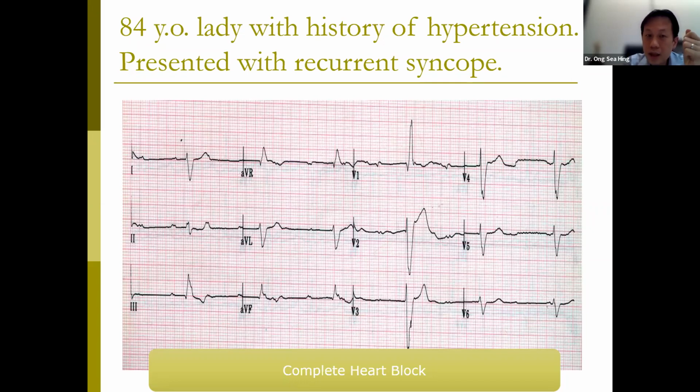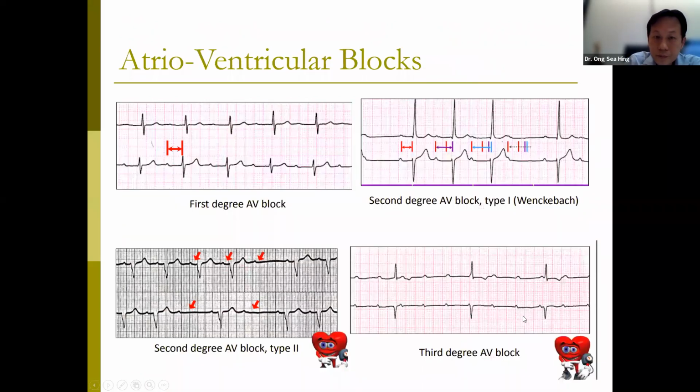and the patient should be put on a temporary pacing wire, because this patient can deteriorate, become hypotensive and go into heart failure. Okay, so this is complete heart block. You need to recognize this, and you need to know that this is a high risk complete heart block.